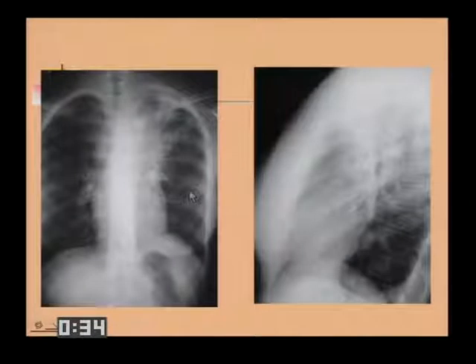Patients can have lymphoma in that same space, anterior mediastinum or middle mediastinum. In this patient, the mass doesn't look that prominent. This, by the way, is a little artifact, not a clip. You can see some fullness in the retrosternum. In an older patient, that retrosternal fullness becomes lucent like an adult.